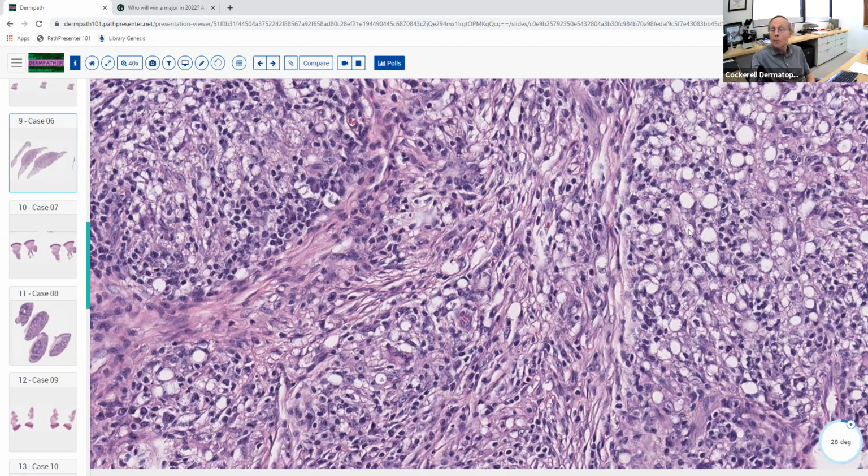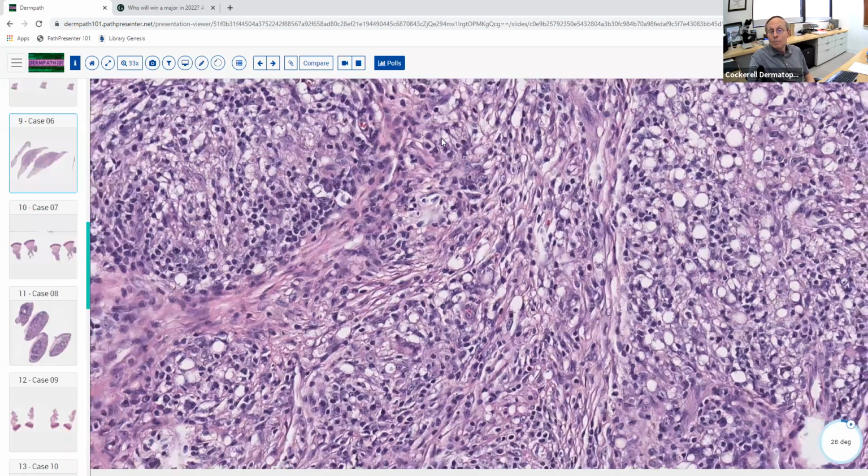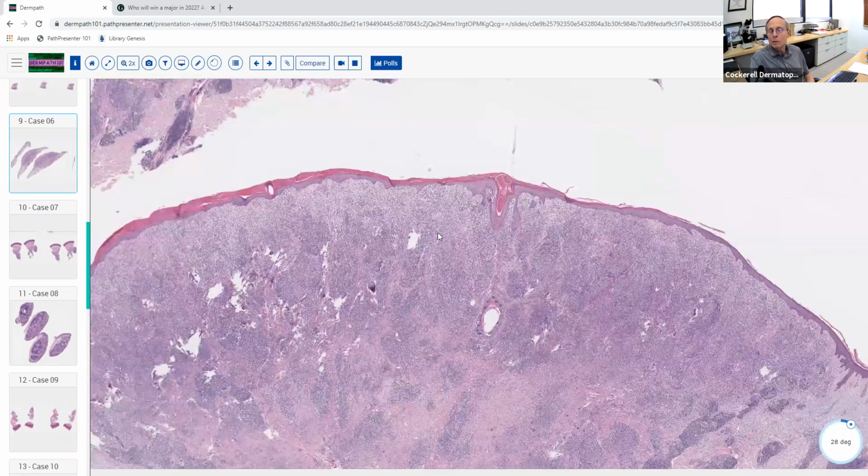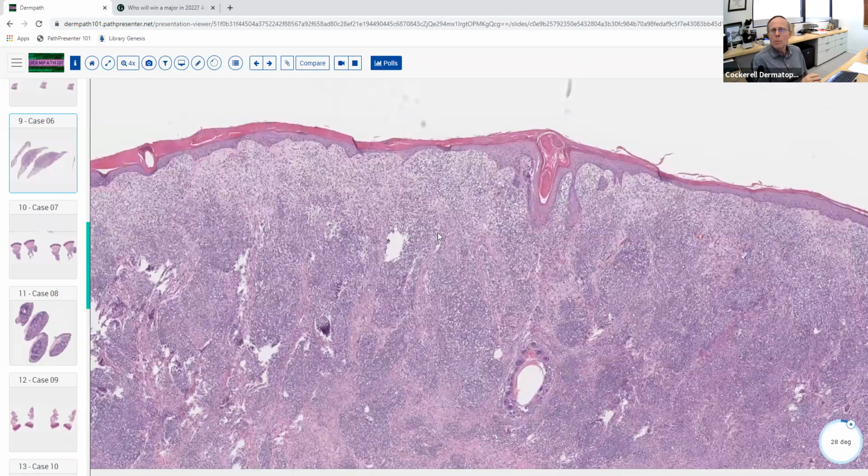and the pattern of involvement in the histiocytes is different. But the third pattern is the dense diffuse infiltrate, which is really very common in leishmania as opposed to histo. Histo usually gives you more of a diffuse infiltrate that's relatively sparse. Sometimes you'll actually see neutrophils with nuclear dust. It can simulate vasculitis more than this pattern. So this would strongly favor leishmania.